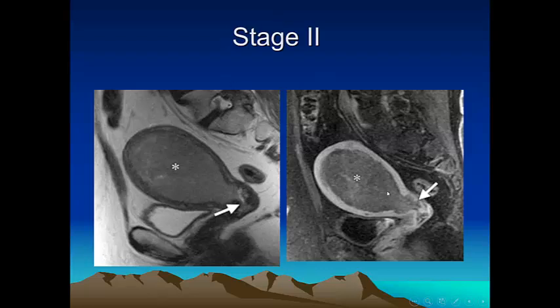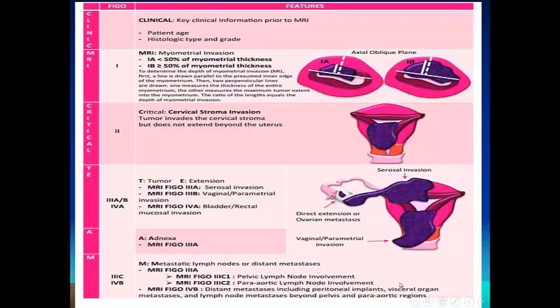Note here in the delayed sequence, the endometrial carcinoma takes faint enhancement, although it is a very, very large malignant mass. It takes faint enhancement in the post-contrast, in the delayed phase also. In the early phase, you will find it will not take contrast at all. And these are the different staging entities of endometrial carcinoma.